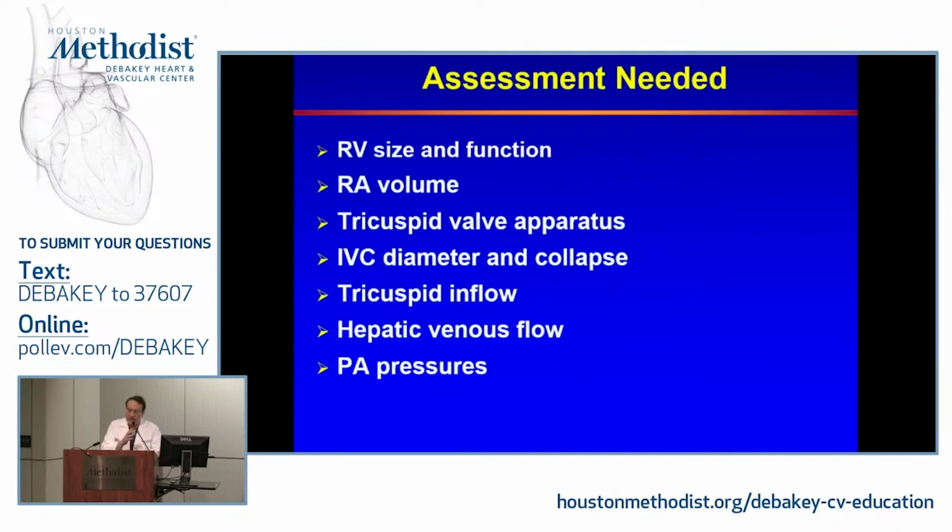Tricuspid regurg. In the last few minutes, what do we need to do for tricuspid valve assessment? One easy thing to do is think of the mitral side, and everything that you say on the mitral applies to the tricuspid in concept. So if you have a significant degree of tricuspid regurg, primary tricuspid regurg for now, we're not talking secondary, you will see an RV that is enlarged and that has a normal function.